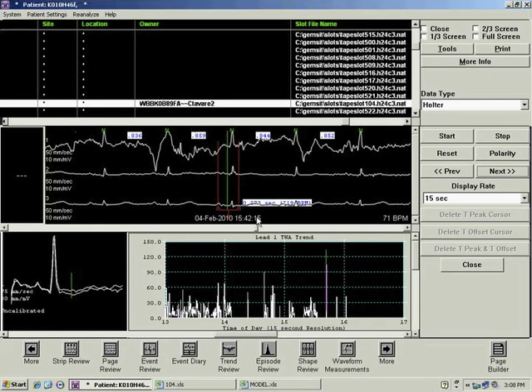Now, with the template and the 15 seconds interval that precedes the time period that you have found on Excel, you can use the algorithm that Caio Tavares will show you to see if this is an appropriate TWA value or if you should discard it and continue with your search for the highest TWA value in the recording.